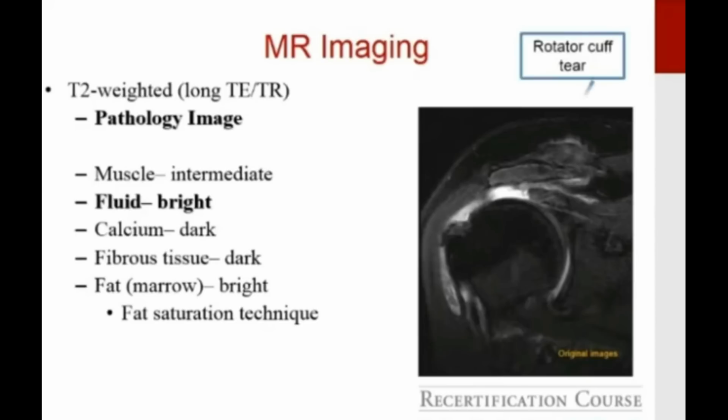The T2 weighted image, on the other hand, has this bright signal that's in the joint fluid. So we see that this is a T2 weighted pulse sequence. These sequences are best for detecting any of the soft tissue abnormalities. Here we see a full thickness tear of the rotator cuff with a thickened, edematous, and retracted torn tendon end with fluid present within the subacromial subdeltoid bursa.